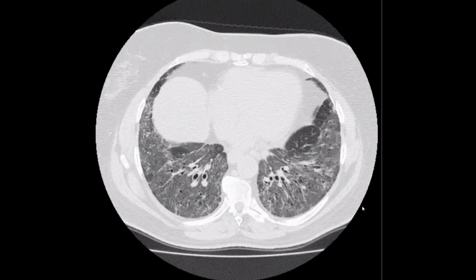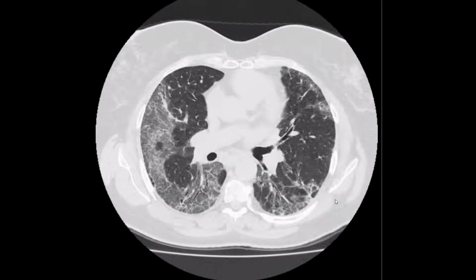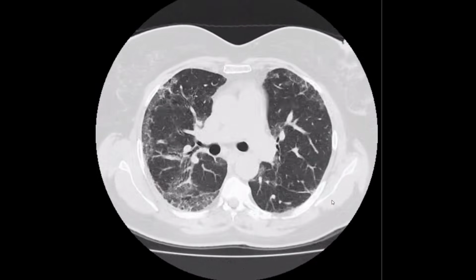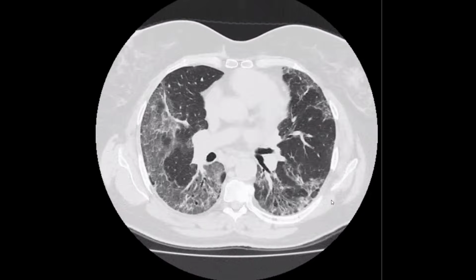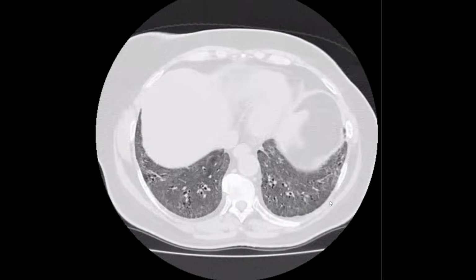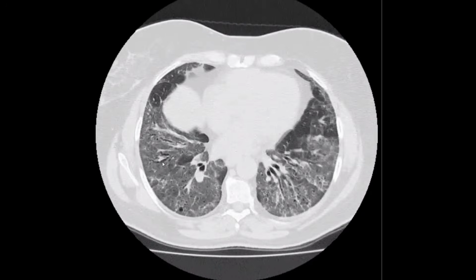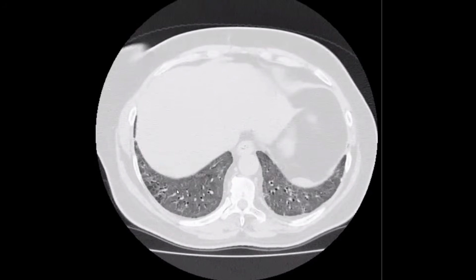Do you think it is hypersensitivity pneumonitis? No, there are no lung nodules seen and okay, bilateral symmetrical. So let's agree together that we have some kind of pulmonary fibrotic changes. Yes. Okay. The predominant feature is ground glass. Ground glass and bronchiectatic changes. Yes, and the minimal bronchiectatic changes. You are right.